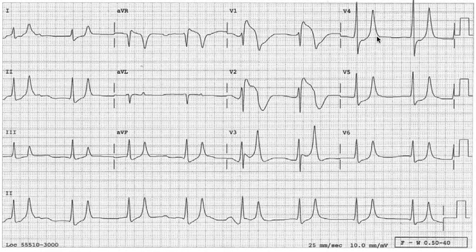So this pattern is very typical, and you'll see it over and over again in many ECGs. So just know this pattern: tall, narrow, pointed T wave in combination with wide QRS complex. This is typical for hyperkalemia.